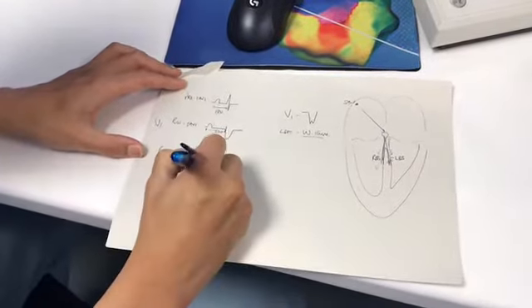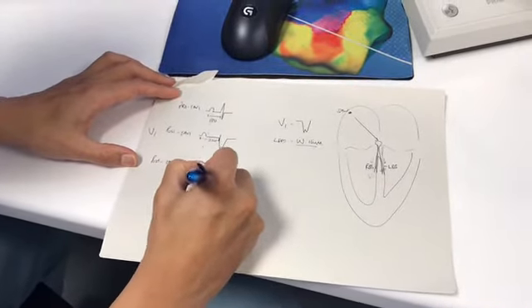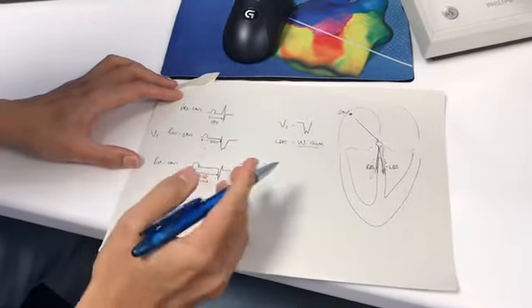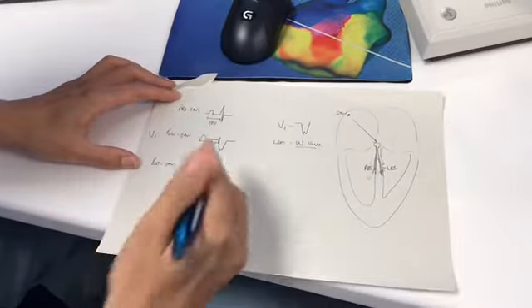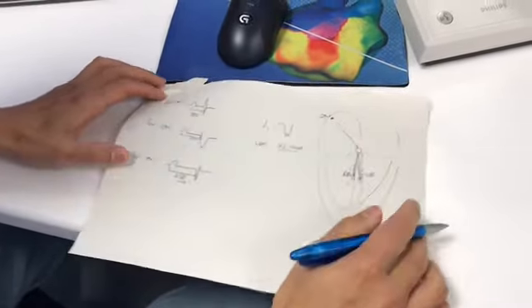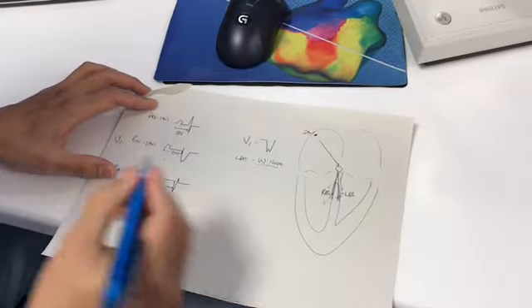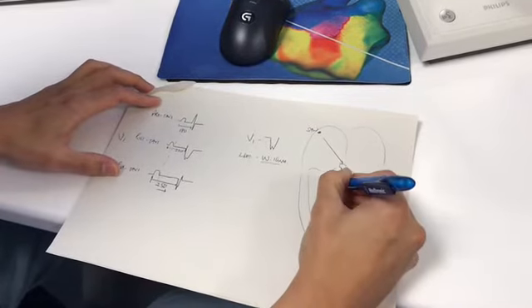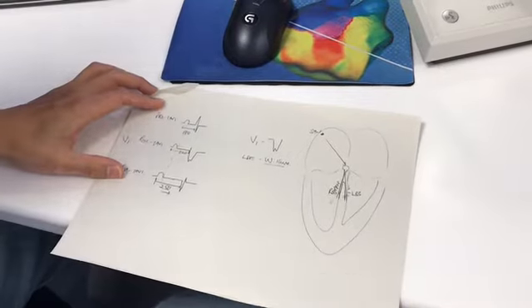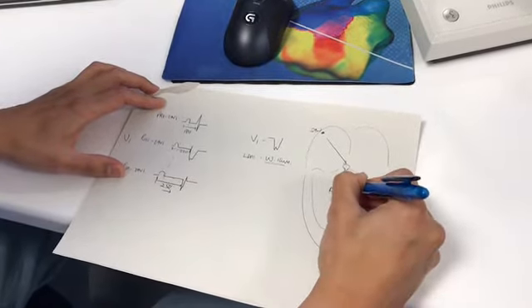No, because if you watch the PR interval, this sometimes expands outwards. So if this goes to 250 from 220, but you get a paradoxical shortening in the QRS complex, all this means is that you're in deeper trouble because the right bundle is now starting to slow. And how slow does it go? It goes so slow that it matches the time of the left bundle, which was already slow and not blocked.